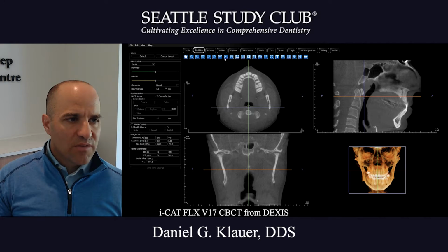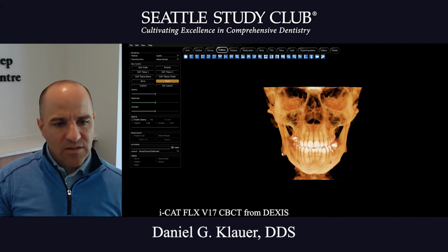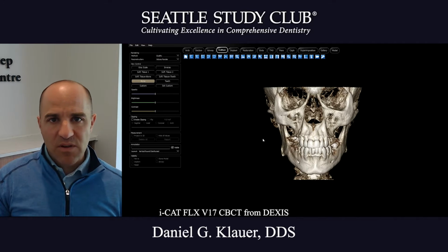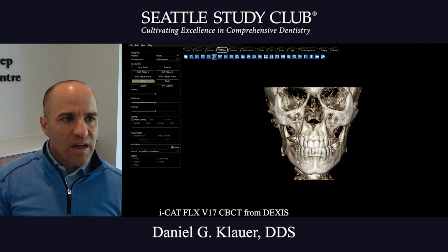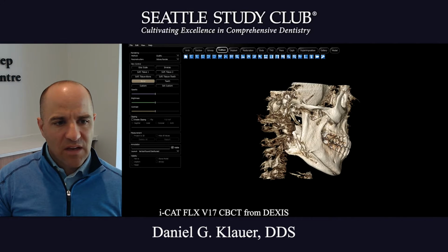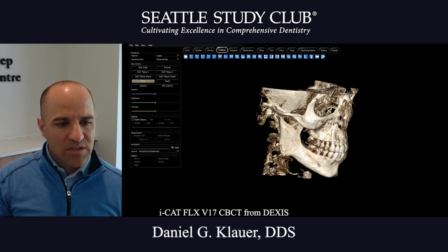As we look at the volume render, the thing that's really pronounced are the pronounced gonial angles. Usually we'll see that in patients with mouth breathing or bruxism. And then it allows us to look at it from all three sides. The stylohyoid ligament shows some calcification. In this case, actually, the stylomandibular ligament, but you'll see that on that 3D rendering quite easily.